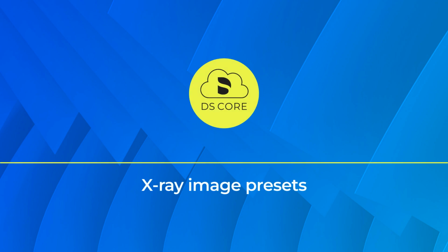In this tutorial, you learn how image presets help you standardize and optimize the appearance of X-ray images in the diagnostic canvas. With this feature, each user can save their preferred brightness, contrast, and gamma settings, so every X-ray opens exactly the way they want, without repeated manual adjustments.